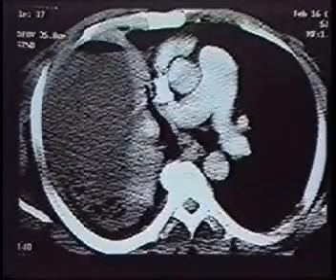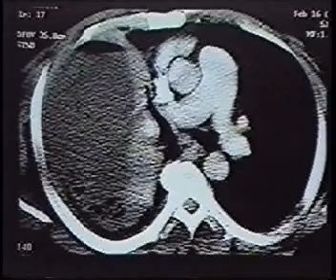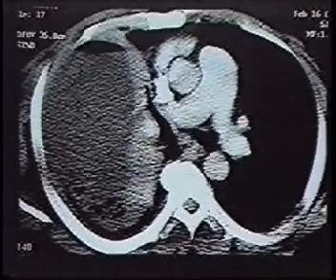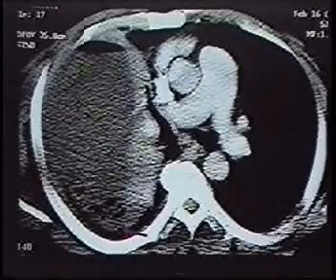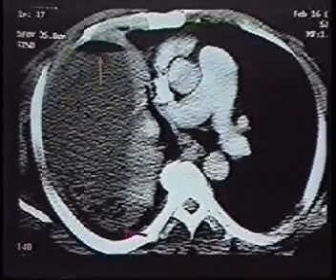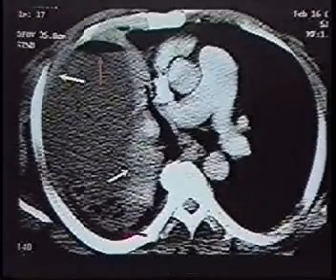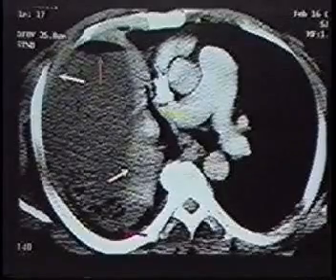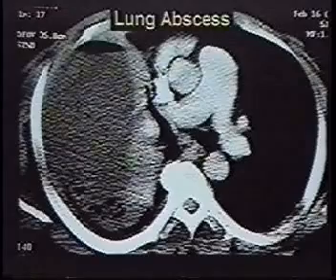And sometimes it can be difficult to distinguish between the two, even when all the factors are considered, such as in this case, a large air fluid collection occupying most of the right hemithorax. On the one hand, there's acute angulation with the chest wall, as well as a significant amount of air, which are characteristics of an abscess, although it also demonstrates smooth walls and displacement of the airway, which are characteristics of an empyema. And on surgery, this turned out to be a lung abscess.